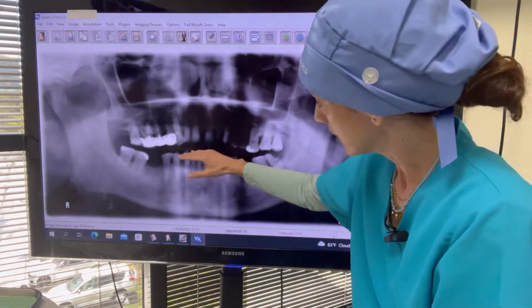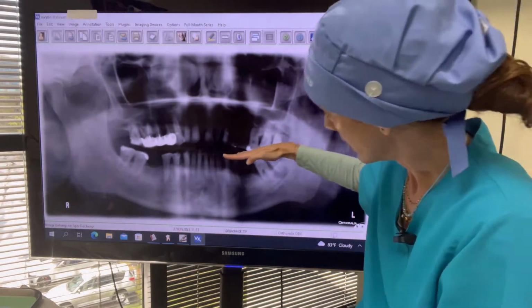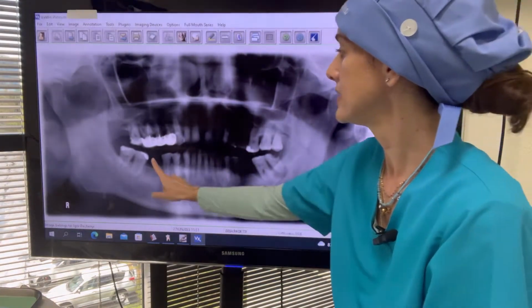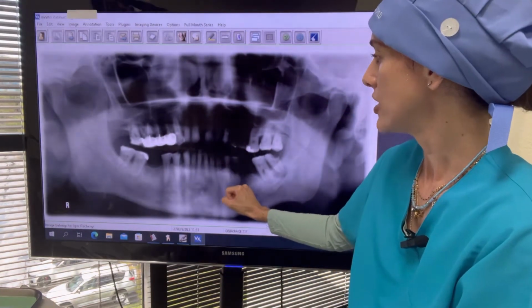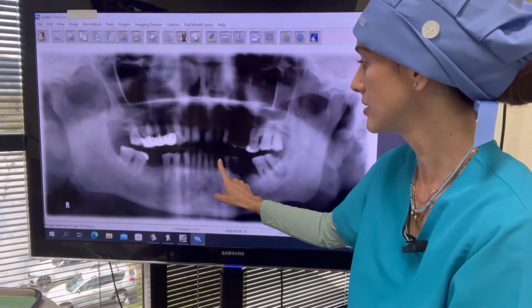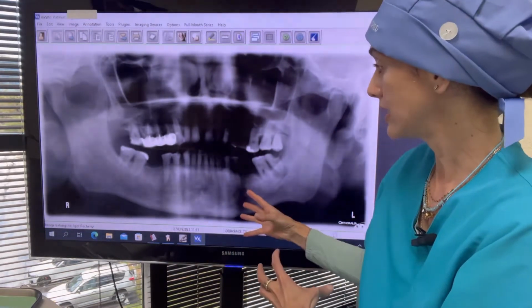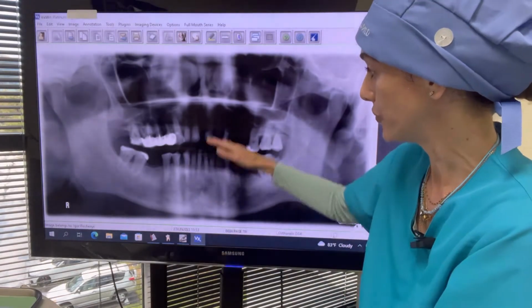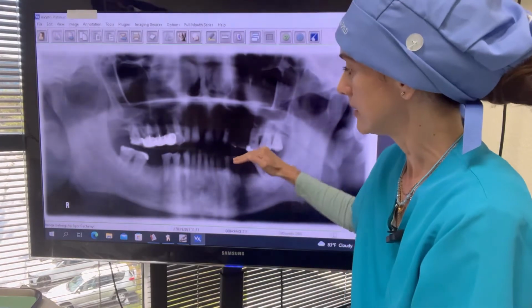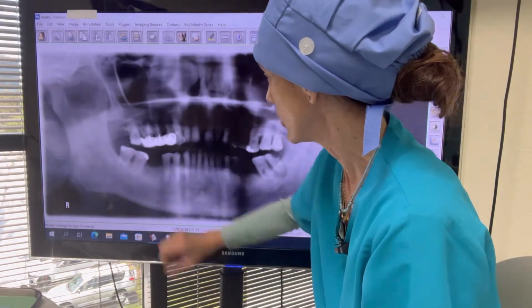We proceed to this area here. We have a lot of wear on the teeth. You can see that it's like a car went on top of them. That is also because by missing these 2 teeth here, this patient is putting a lot of forces on these teeth here, these anteriors and these premolars here. So he has grinding problems as well, plus all the forces of mastication on such a short area make the wear even larger. And here we have some restorations.